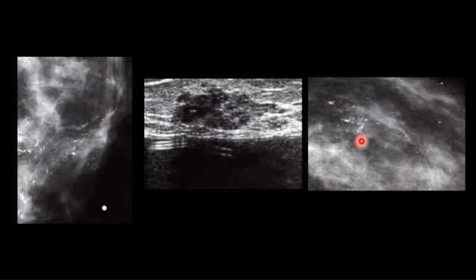No, BI-RADS 3 is 98%. I'm sure it's benign. Are you 98% sure this is benign? So you give it 4, even maybe 4C, 5, something in the high grade. You need to follow it closely. You need to take a biopsy, whatever. Okay, do an ultrasound. You do something about it.